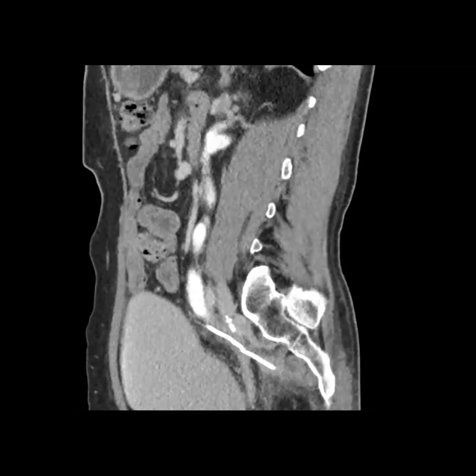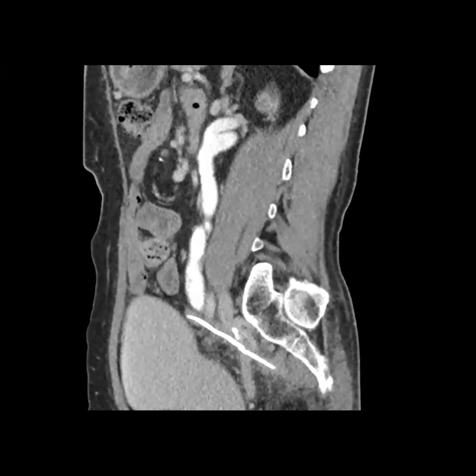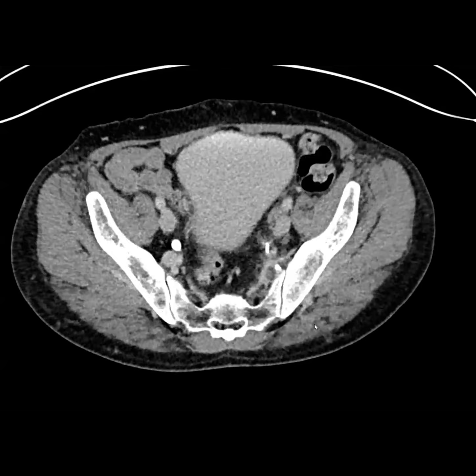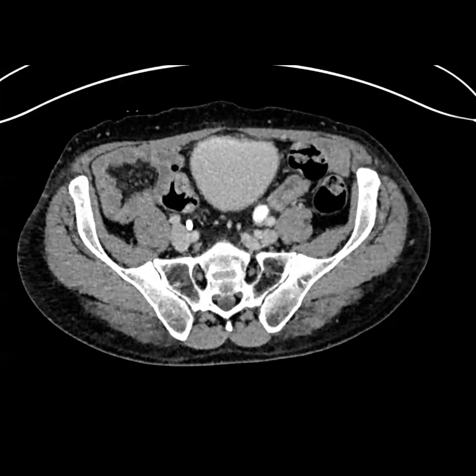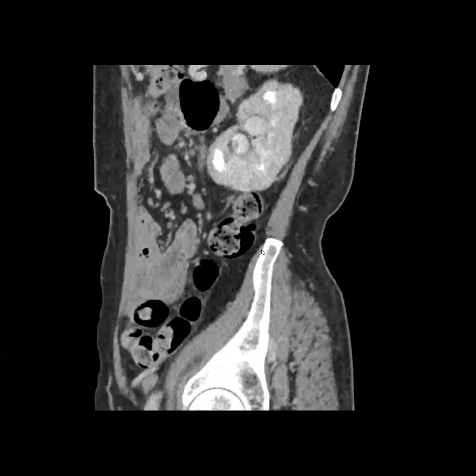Is it like a pancreatic duct stent migrated? That's an excellent thought. Those usually have a loop at one end. This one has a little bit of a kink, and it was metal. It was pretty bright, right? Super, super bright. So metal, not plastic. I can't imagine that someone ingested that. How is that even possible? Oh my goodness. But okay, I'll tell you what it is, unless anyone has any last guesses.